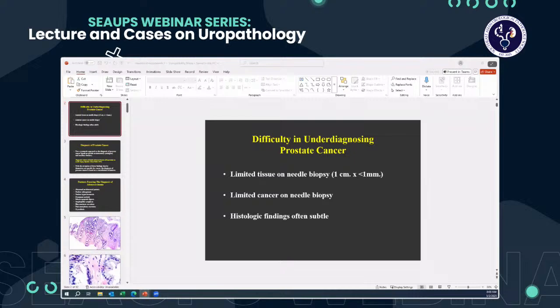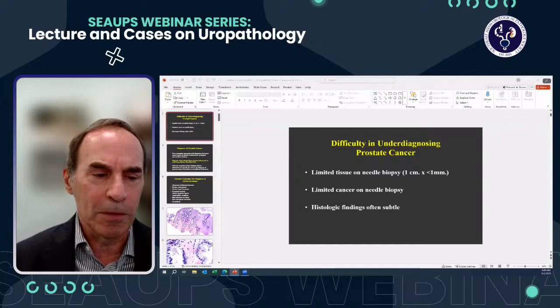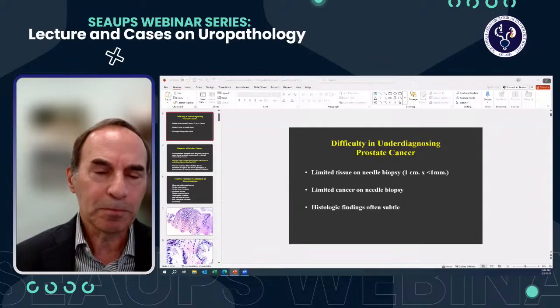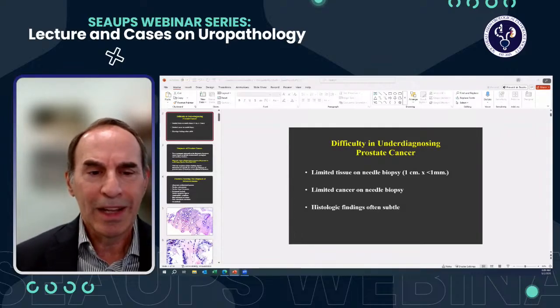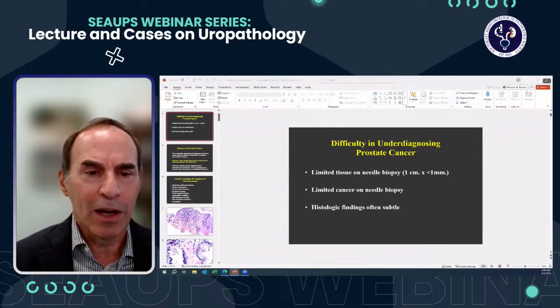We then turn our attention to the nuclei, looking for enlargement, hyperchromasia, prominent nucleoli, mitotic and apoptotic figures. Then the cytoplasm, which is often darker, and then intraluminal contents, whether it's blue mucinous secretions, pink amorphous secretions, or crystalloids.